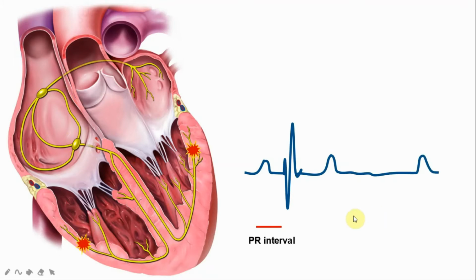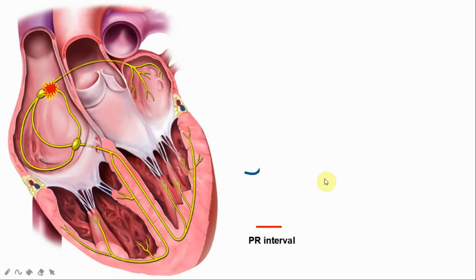Now, for the second degree heart block, the most important part that you should look for is the PR interval. I mean, every part is important in the ECG, but the PR interval will give you the most important information to get into the depth of the second degree heart block. So Becky, could you please tell us a little bit more about the conduction system of a normal ECG so that we can understand a little better? Thank you.